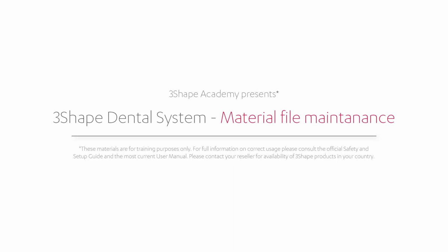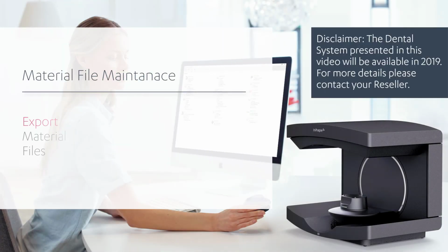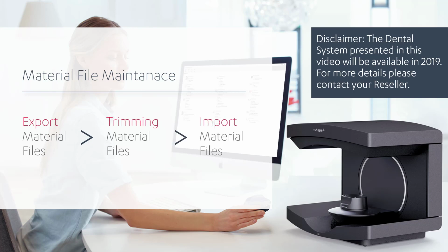In this video you will learn how to maintain material files in 3Shape Dental System. In order to keep your PCs and 3Shape Dental System functioning as well as possible, we recommend that you regularly maintain your materials.